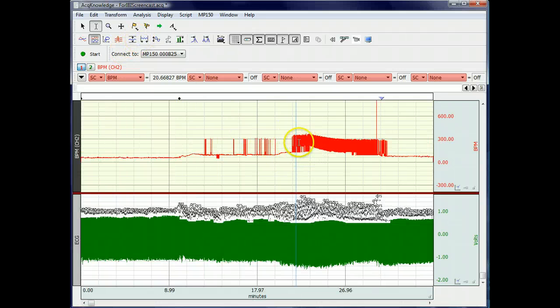And so you can see actually this long segment here where we've got all these places where T waves were identified. In this particular data file, the subject was resting at one point and then exercising and then resting again afterwards, and so that's why you see this variation in the heart rate, but it also changed the ECG to some extent, which is why this single threshold through the entire file wasn't completely effective.